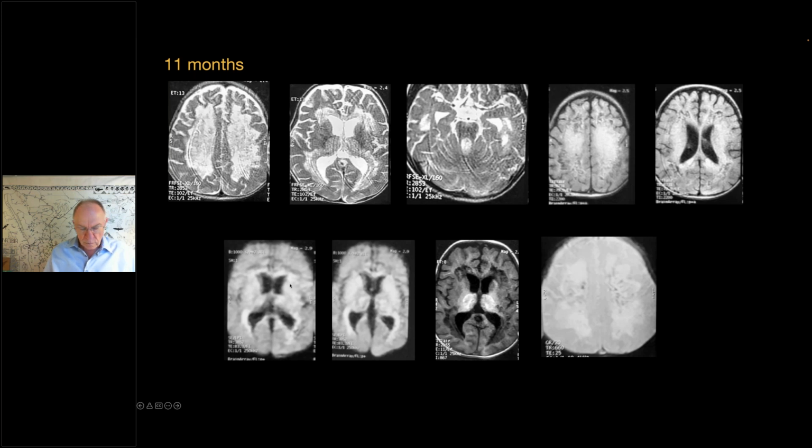Diffusion, there was some area of restricted diffusion in the periventricular regions and also in the deep gray nuclei. This is a non-contrast T1 weighted sequence, and you can appreciate that there are T1 hyperintensities involving the bilateral thalami, and the corresponding white matter changes demonstrate hypointensities. I don't have an SWI sequence centered at the deep gray nuclei, but there are some areas of blooming in the abnormal white matter changes in the bilateral frontal and parietal regions.